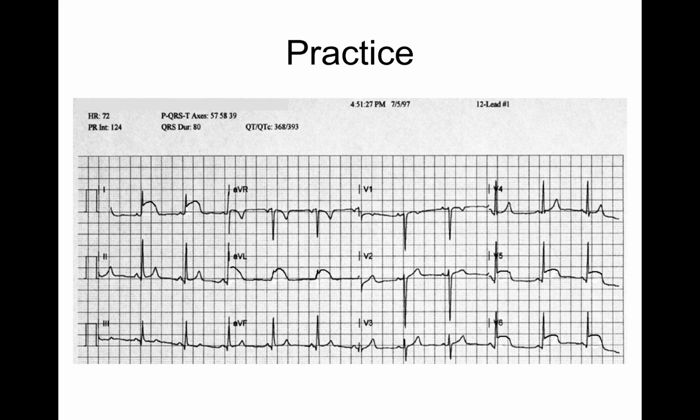2 contiguous leads. Now I'm going to go to my other lateral leads right here, 1 and AVL. Now I have also positive indications. This is not a good sign right here. This is not a good sign here too. So what part of the heart's having a heart attack is the entire lateral portion of the heart is having a heart attack right now. Not a good thing.